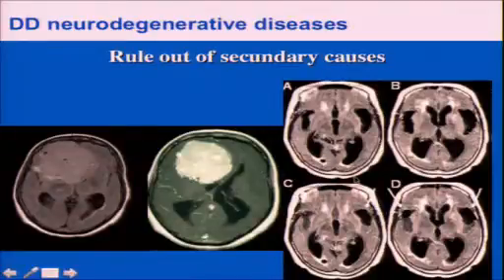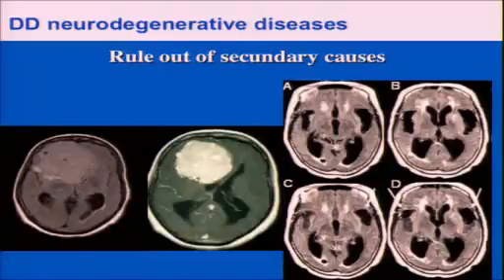The other patient here on the right side has a normal pressure hydrocephalus, or an enlargement of the internal ventricular system, a discrepancy of the width of the inner and outer CSF spaces. So there's an increased pressure in the brain, and if you release that pressure by, for example, a drainage via shunt, then you can resolve the problems.